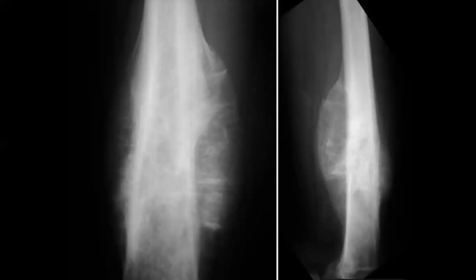It is not like a short zone, right? It is a wide zone. You cannot recognize which area could be the normal one, and after that it becomes abnormal, right? So you have here the appearance of periosteal reaction, which looks aggressive, and probably there is soft tissue. You need to check with MRI. So it looks like an aggressive lesion.